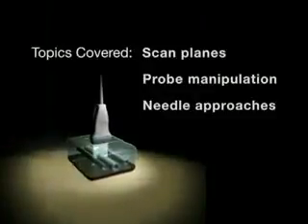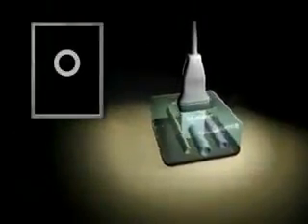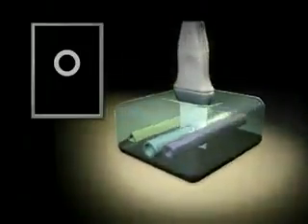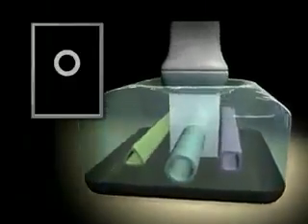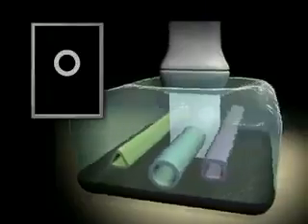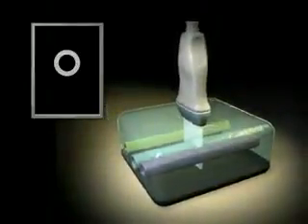In the following figures, we are looking at a schematic of an ultrasound transducer applied to a tissue-equivalent phantom with 3 different embedded objects. A depiction of the ultrasound screen is inset. We generally image long cylindrical structures with an ultrasound beam that is essentially planar. Short-axis imaging cuts this cylinder transversely, revealing a circle. Long-axis imaging cuts this cylinder longitudinally to create 2 parallel lines.